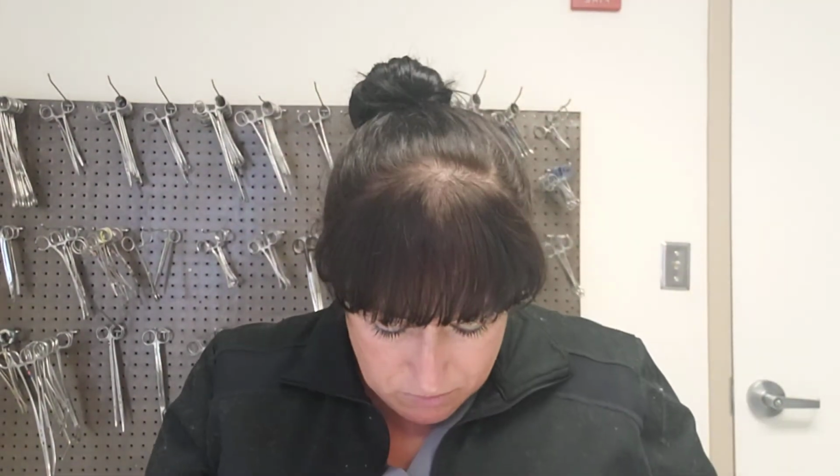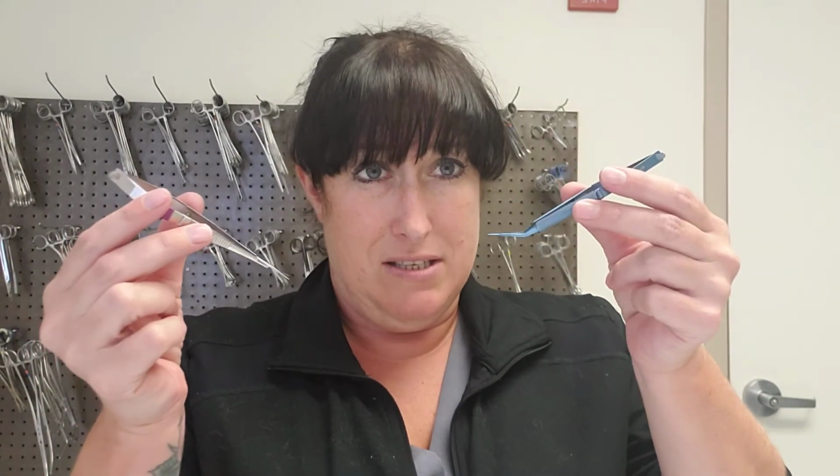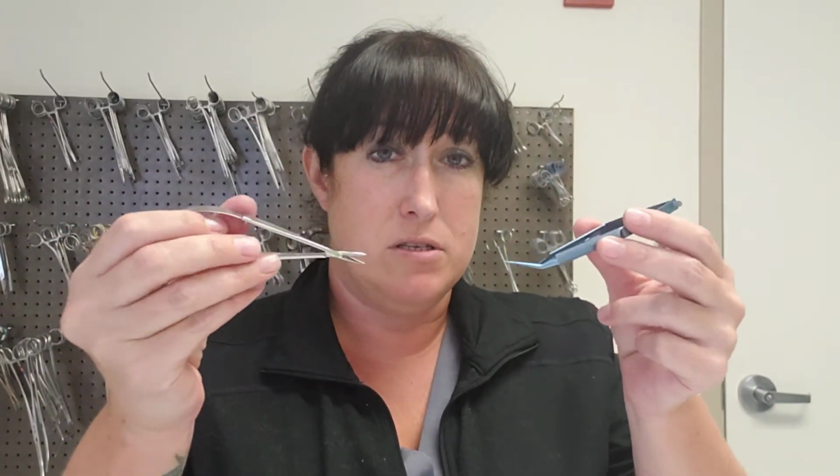All right. I also want to go over microinstrumentation. I don't really have anything fancy to show you. Micro means small, so small instruments. Delicate surgery, this might be surgery on the eye, or delicate brain surgery. There's ear surgery, anything where a microscope would also have to be used. And so, of course, if you're doing delicate microsurgery, you're going to have smaller instruments. And these are just some examples of smaller instruments.